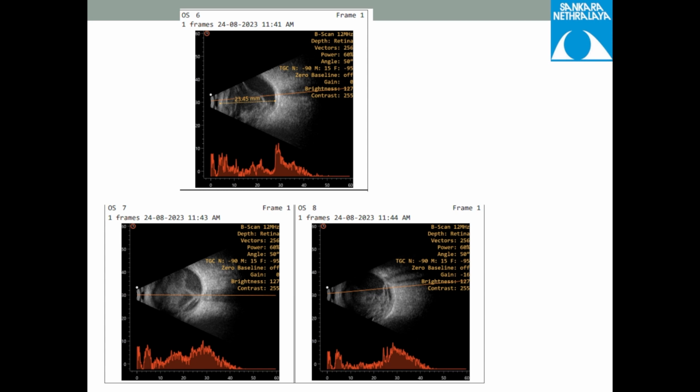There's the scleral spike, and then you have the spikes closer to it, almost 75% of that spike, which means it's medium to high reflectivity, closer to the reflectivity of retina and sclera. So this lesion is medium to high reflectivity, and there are double membranes attached to the ONH. You can see the ONH shadow, right? I don't know what section this is, but we do see a double membrane point attachment somewhere close to the ONH.